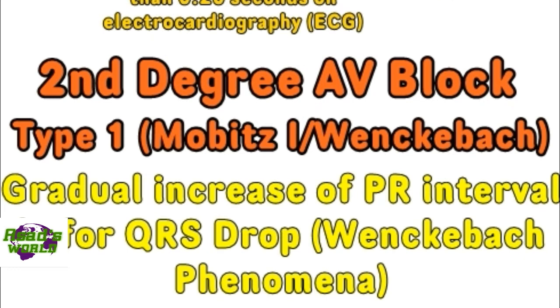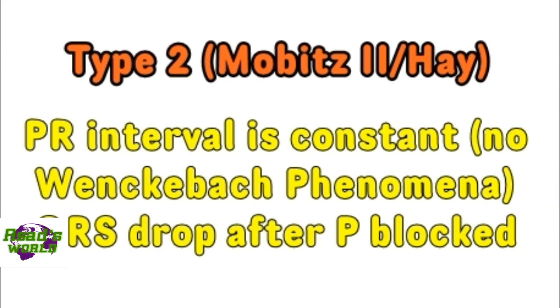Now moving forward to the second degree AV block, it has two types: type 1, Mobitz 1 or Wenckebach, and type 2, Mobitz 2 or Hay. In type 1 there is a gradual increase of the PR interval before the QRS drops. So the PR interval increases gradually and then the QRS drops. In type 2 that is not the case. In type 2 the QRS doesn't drop after a gradual increase of the PR interval, but it drops right away without any increase of your PR interval. And the gradual increase of the PR interval before the QRS drops is your Wenckebach.